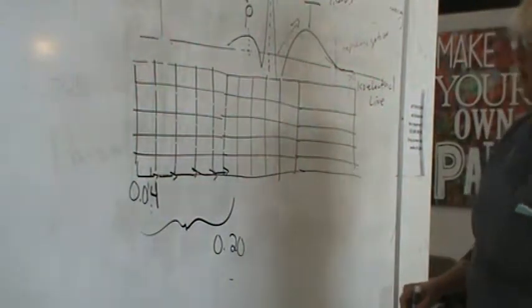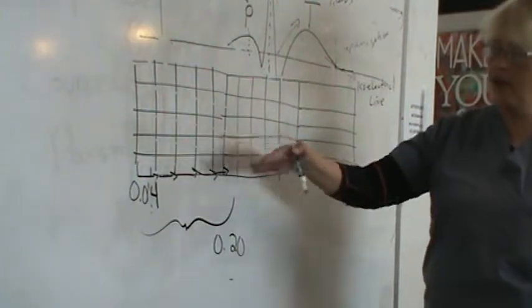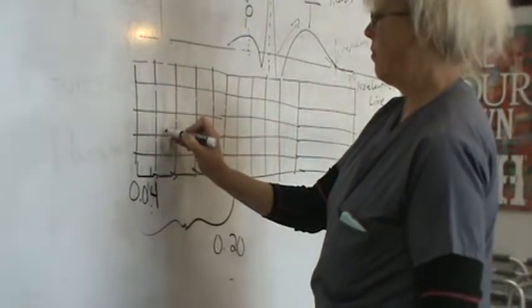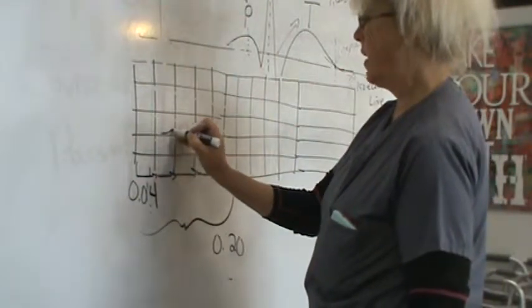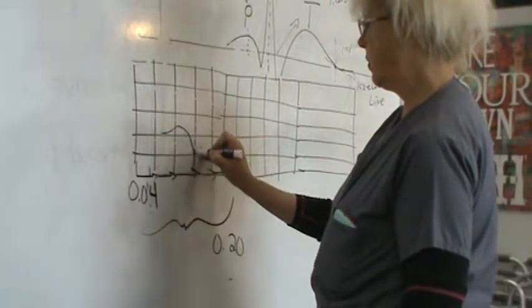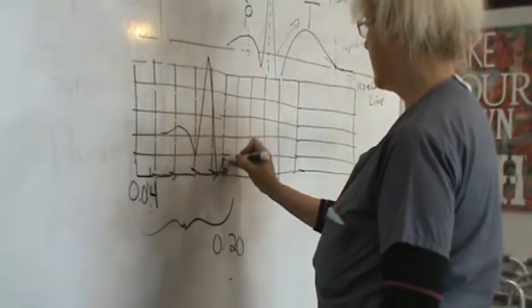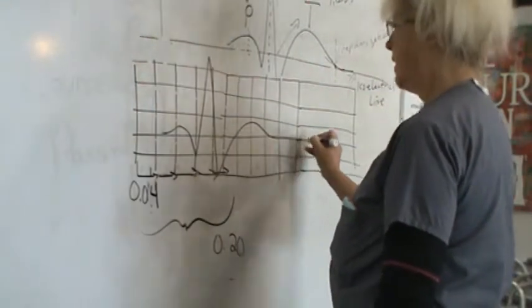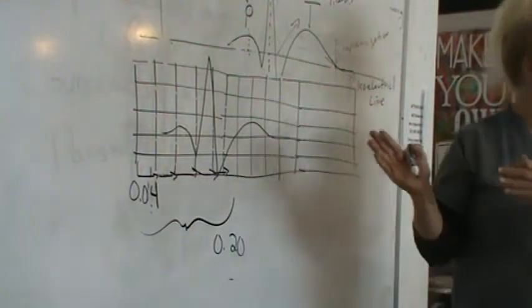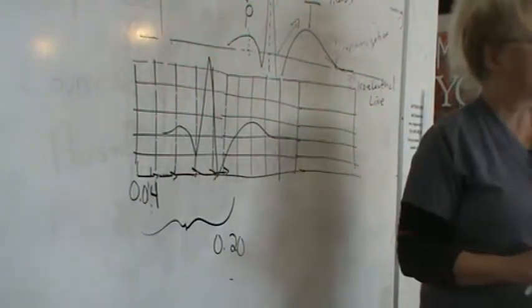Okay. So let's see, when the electrical activity of the heart is translated onto a grid, what does it turn out that we have? Well, if we start here, we have our P wave, and then we have Q, R, S, T, and off we go. Now we have something to measure this with, don't we? Now we can see the distances, can't we?